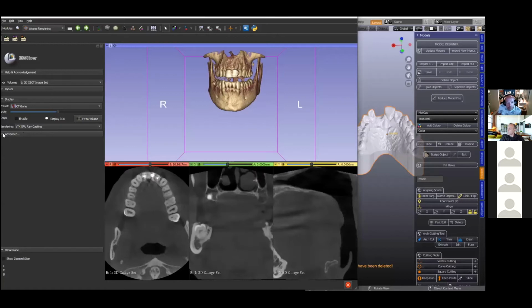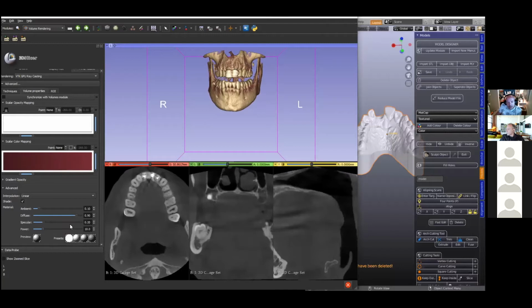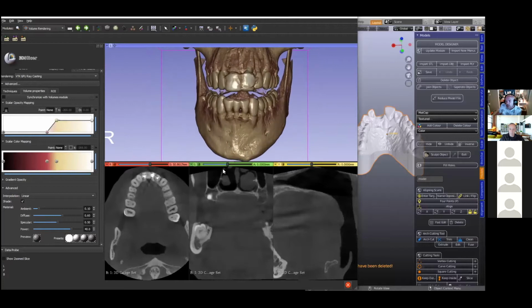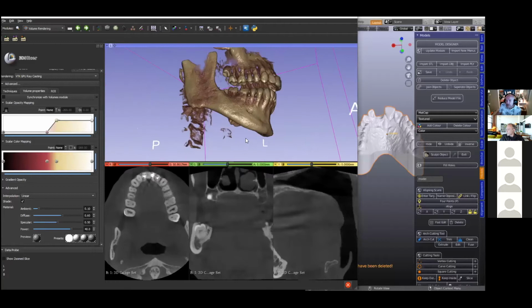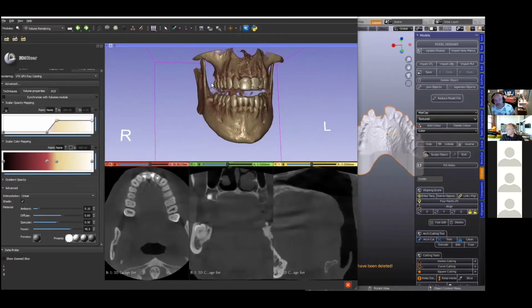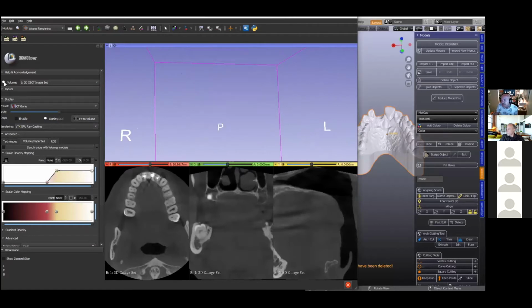And for those who really want a good viewer experience, we can go to the advanced section, and then we can make all different types of colors and everything with it. So this is really cool. You can make this transparent or whatever you want. So this is actually a very nice, clear scan. All right, when we finish with it, we can just close the eye. We don't really need it, but if you want to use it, you can use it. This is not on this list, but it doesn't need to be on this list.